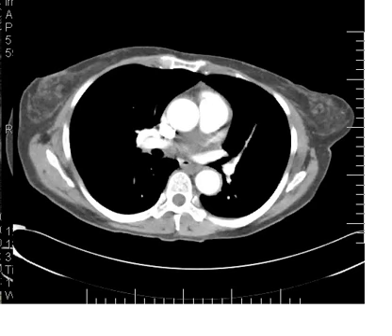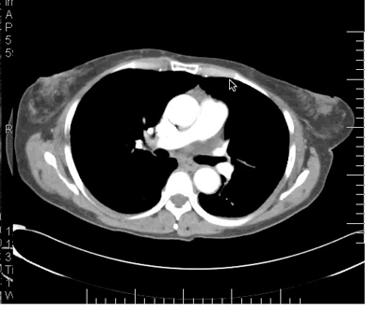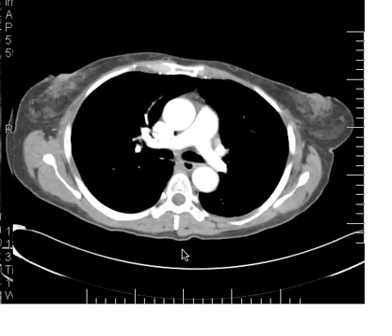And now as we go up higher, you see that the main pulmonary artery is diving back and up a little bit, posteriorly and a little superiorly, to branch right under the aortic arch. So here you see the right main pulmonary artery coming off a little lower. Then we go up a little higher. Here's the left main pulmonary artery coming up a little higher than the right. Once again, right and left main stem bronchus, esophagus, ascending aorta, descending aorta, and superior vena cava.